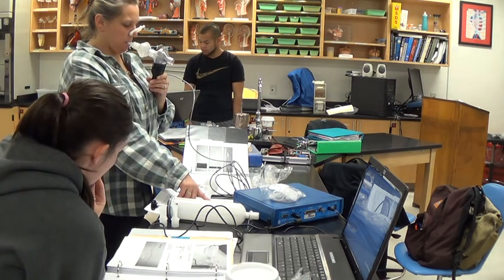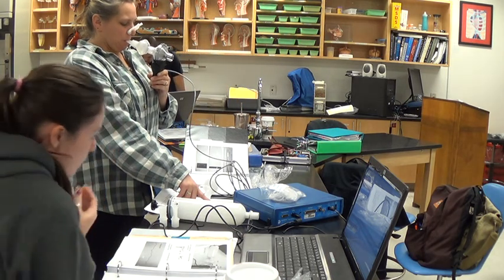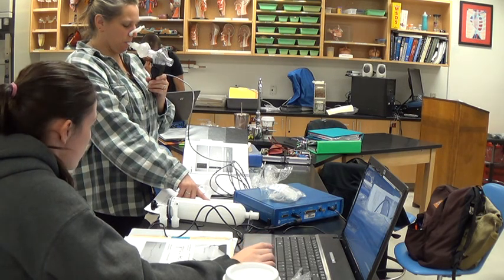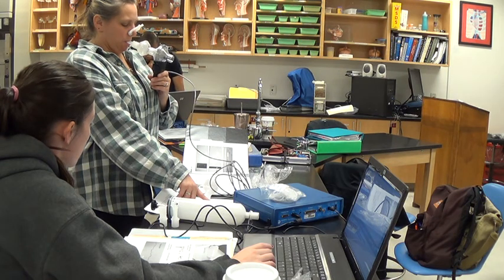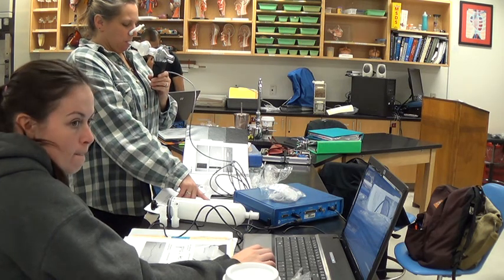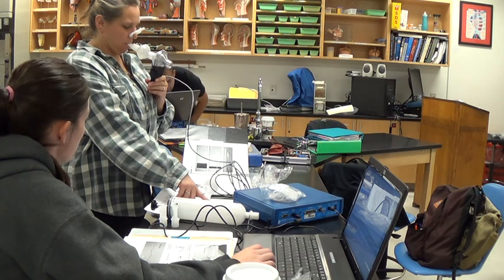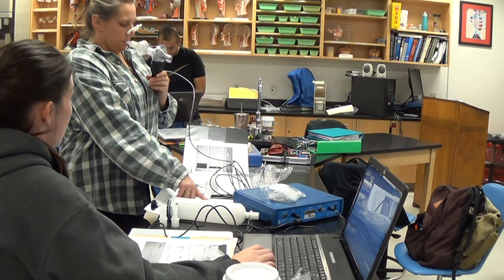The top of this one? Uh-huh. And then go as close as you can get to 1 second. And it goes negative. So maybe are we supposed to do this one? It tells us to do the second one, but the numbers match up with that one. Was this one forced? Did you do it as fast as possible? That's why this is important, because you want to do it as fast as possible. So we're just counting time. It doesn't matter if it's negative.